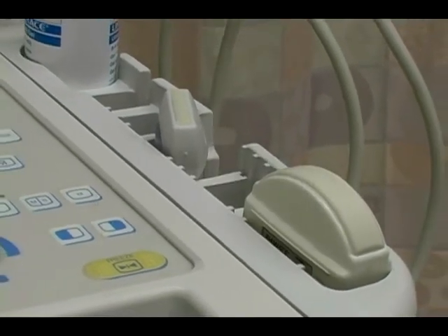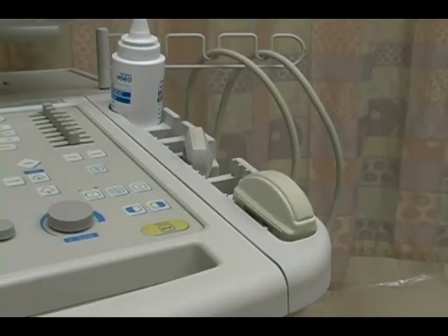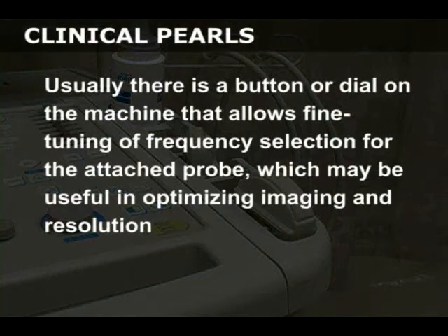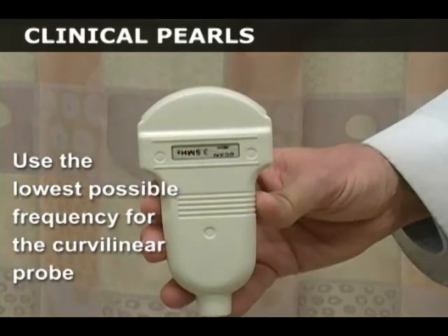For each probe attached to the ultrasound machine, there is a range of ultrasound frequencies unique to that probe. Usually there is a button or dial on the machine that allows fine-tuning of frequency selection for the attached probe, which may be useful in optimizing imaging and resolution. In general, using the highest frequency possible for the linear probe attached optimizes best imaging of superficial structures. In general, using the lowest frequency possible for the curvilinear probe attached optimizes best imaging of deeper structures in the body.